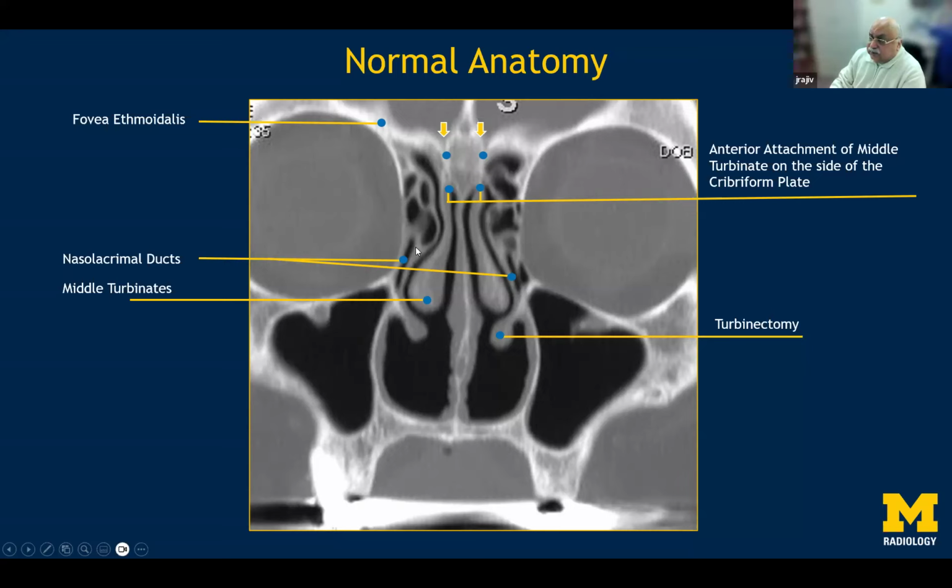So attachment of the uncinate process closer to the medial wall of the orbits is another danger spot, because you can pull at the uncinate process while dissecting it out and then injure the medial wall of the orbit and create a subperiosteal hematoma, or you can create a fracture which can grow on its own and chronically result in prolapse of the extraconal fat into the ethmoid sinus and cause changes in the overall alignment of the globes.